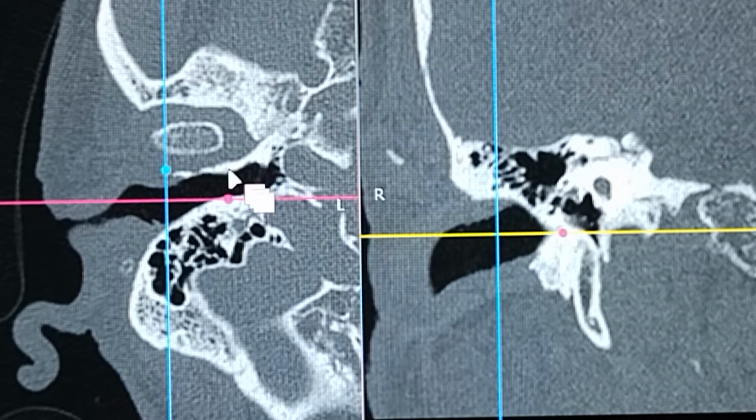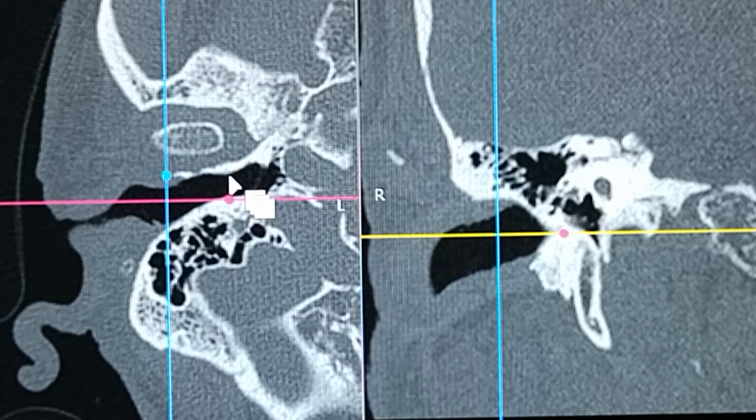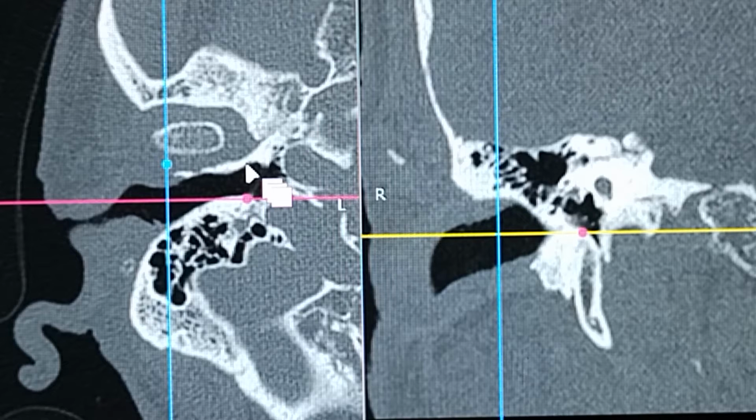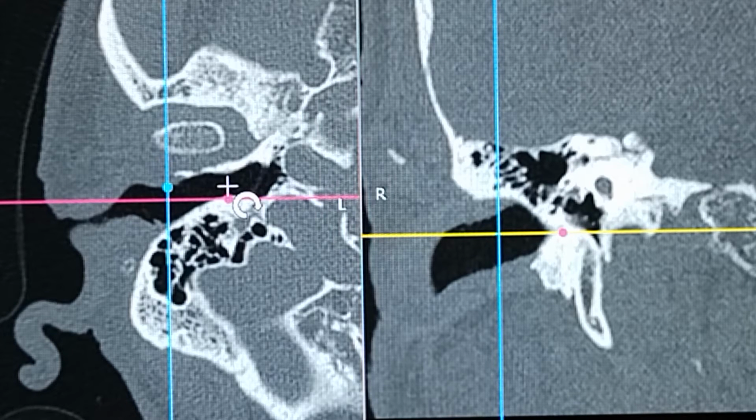It's basically a bony growth, which you can see like a bulbous form over here in cases of exostosis, completely occluding the EAC of the patient. You can see some dehiscence over here sometimes in cases of erosions or infections, or basically malignant otitis externa, recurrent infections. You can have dehiscence over here in cases of skull base osteomyelitis, which take origin from the external auditory canal.